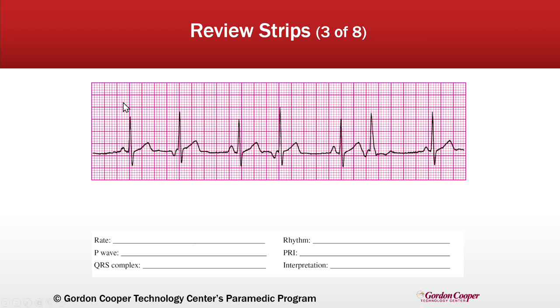And then as we look here, we see 1, 2, 3, 4, 5, 6, 7. Although when we're looking here and we're just walking across, we notice this seemed to come early, as well as this little guy here looks a little wacky. So we got a rate of, what do we say, 3, 6, 7. So we've got a P wave here. Rhythm looks pretty regular, other than whenever we get into a little wacky stuff here. So the P wave looks pretty regular there.